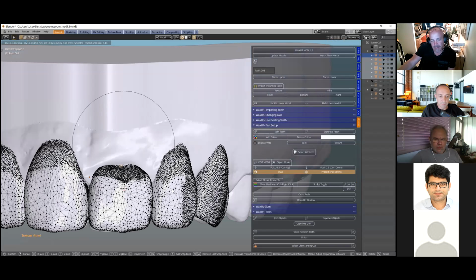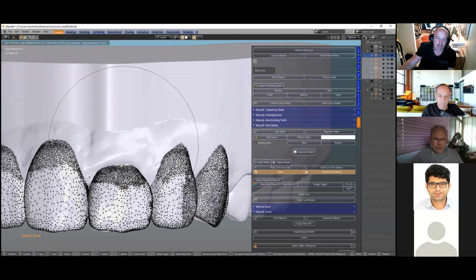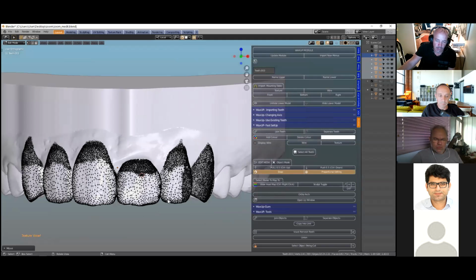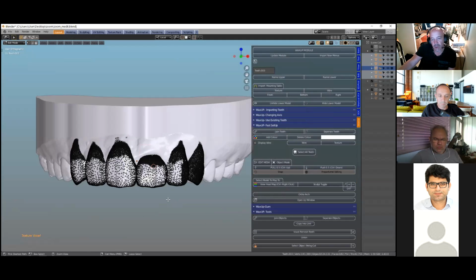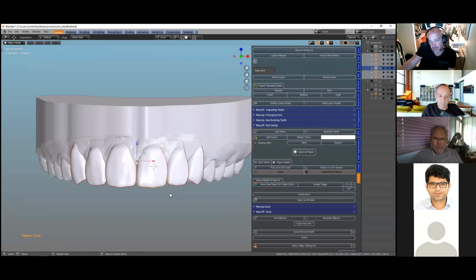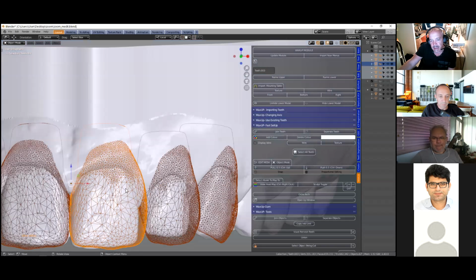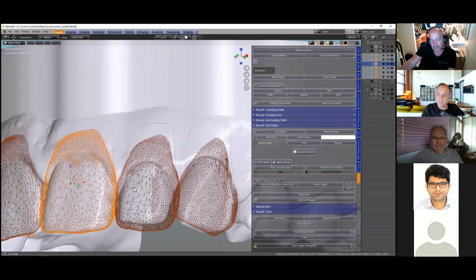I would say maybe having a longer tooth ratio would be ideal. So this gives you a good opportunity to see what's going on. So again, wireframe, we can see how far they're extending to actually give this person a lovely smile.